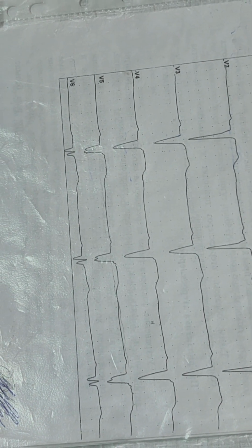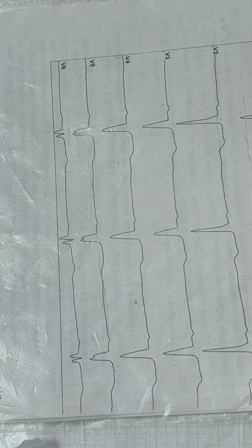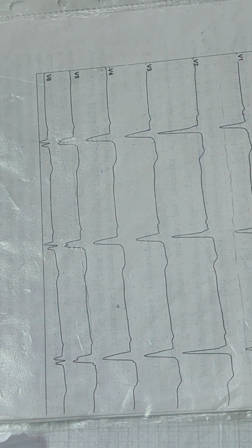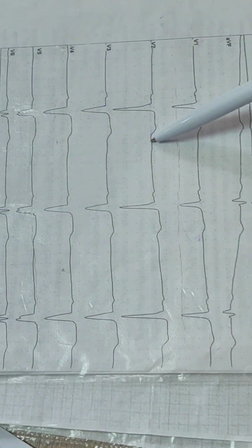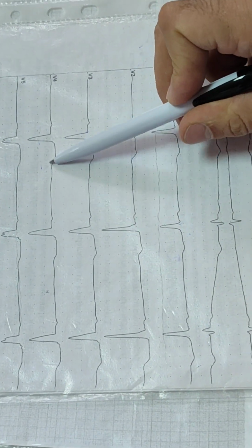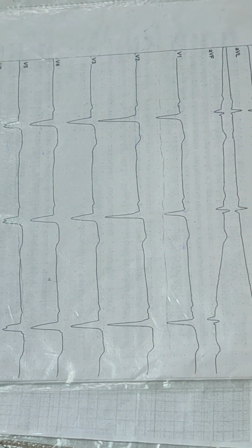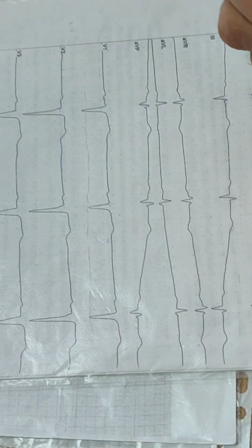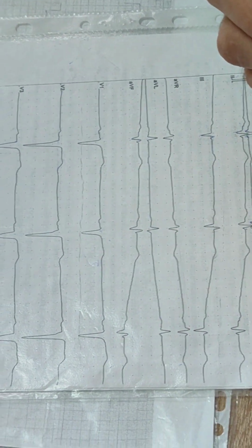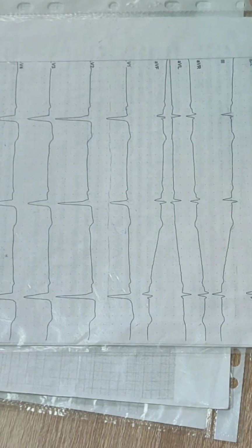So, is myocardial infarction present or not? Q waves. So, myocardial infarction is present. Stage. ST segment is very close to the isoelectric line. So, if we know the history of the patient and the patient is sick more than 1-2 weeks, it could be subacute stage. It is the beginning of subacute stage. If we don't know this history, we can conclude acute stage 2. It will not be a mistake.